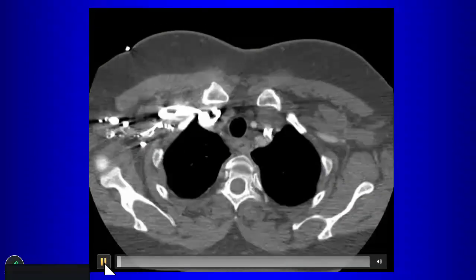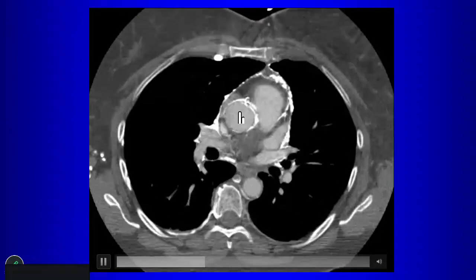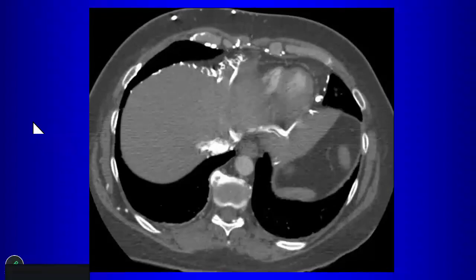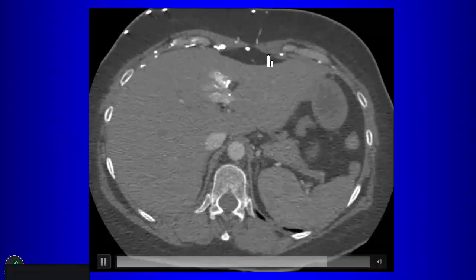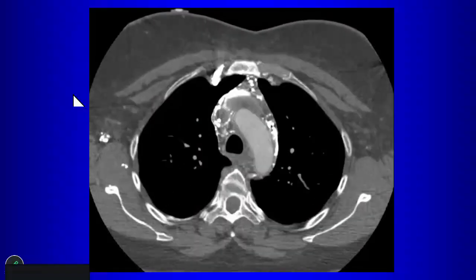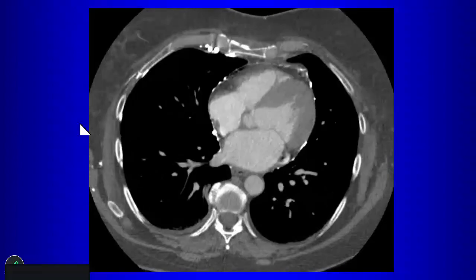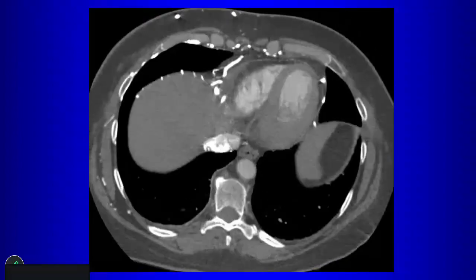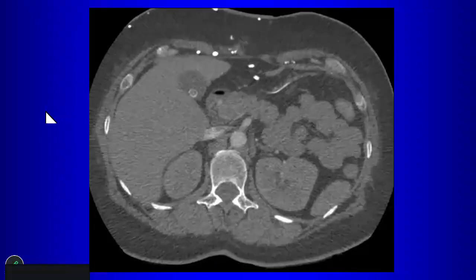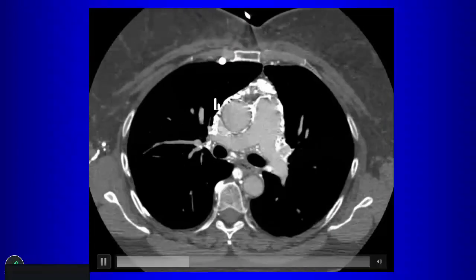So what you can do is widen the windows and look at vascular windows, and it can show you the different phases of the contrast, or contrast that is more dilute as opposed to this very dense undiluted contrast. And this can help you to follow the blood vessels to kind of localize where the obstruction might be. But whenever you see all of these collaterals in the mediastinum, think about central venous obstruction, and then try to make sure that your central veins are okay.